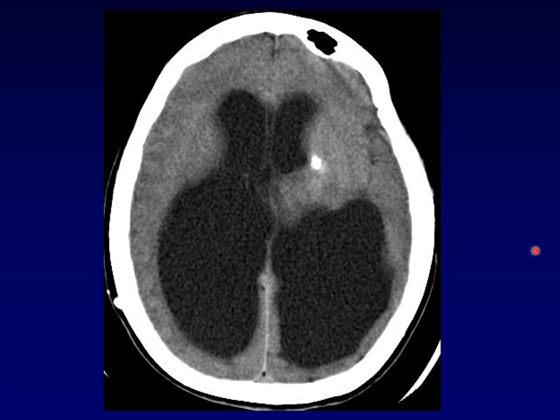I'm giving you a second to think about it here. Well, recall the picture of that 90-year-old. It wasn't just the ventricles that were enlarged. It was also the sulci that were enlarged because the brain was atrophying and the CSF was taking up all that extra space, both ventricles and sulci. In this case, the ventricles are enlarged, but the sulci are compressed. So this is not just atrophy of the whole brain. This is entrapped CSF within the ventricles that can't go out and get reabsorbed, and it is expanding the ventricles.